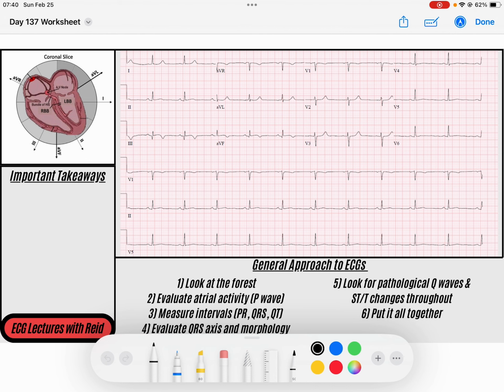So let's jump into this fun ECG. This is a patient who, for clinical context, has had one week of off and on chest pain with some associated diaphoresis, which just means they were sweating a lot, right? And so they come in, finally, they're stubborn, and their family was like, you need to go see the doctor, right? It's a 60-year-old female with high blood pressure, diabetes, former smoker, kind of some vascular risk factors.